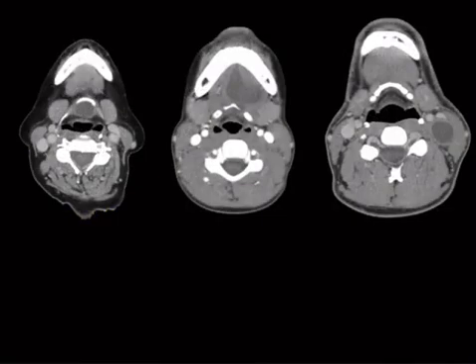So here is just a rapid review, this versus that. We've got three cystic lesions here, here, and here. Now, let's separate out location. So the first one is the one that we talked about already. This is our thyroglossal duct cyst. And notice that it's right around the level of the hyoid. Now contrast that to the second one, which is more anterior, sort of sublingual location, right abutting the mandible. And then the third one, which is lateral. So you have two that are central, one that's more anterior than the other.